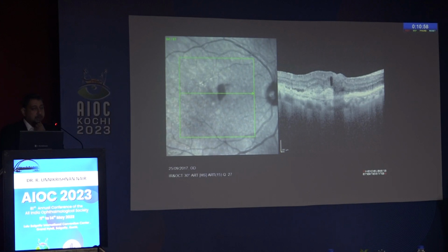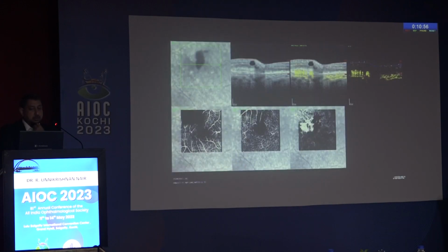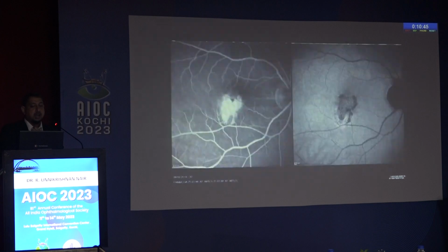Just to show a few brilliant uses of the OCTA. You can see the structure of the vascular net much better than in any angiographic process, where pooling and leakage obscure the margins. Here you see the blood vessel edges very carefully.